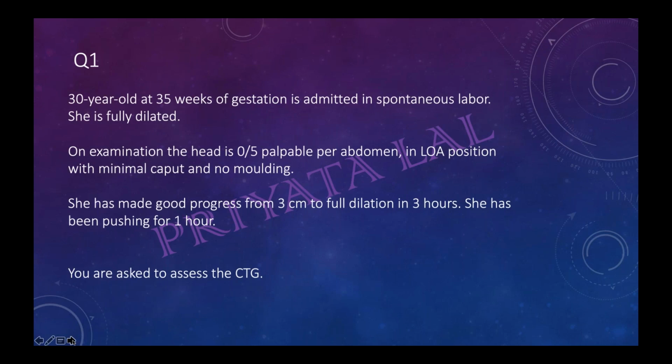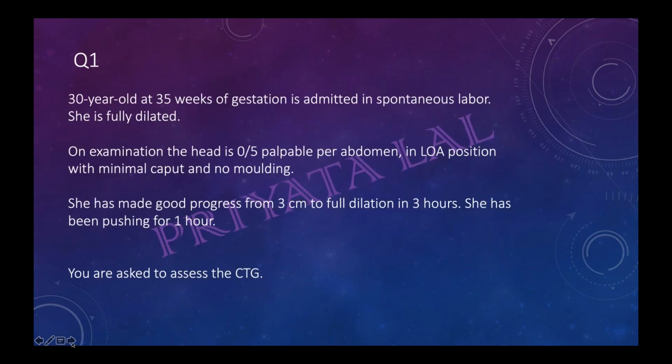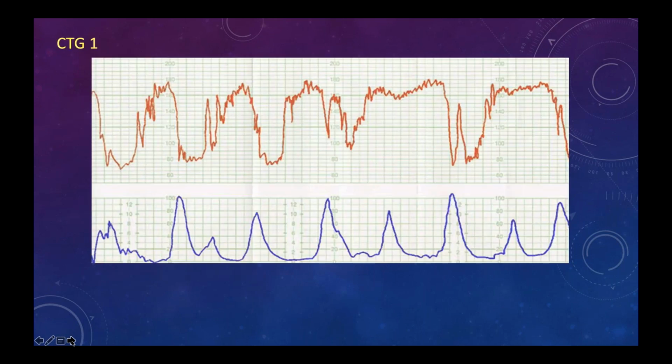Okay. Because I am not asking about management, this question makes no sense here. But I put it. So this is the trace. Actually, today we are doing traces only. So Vishnu Priya, you have to tell me about the trace.